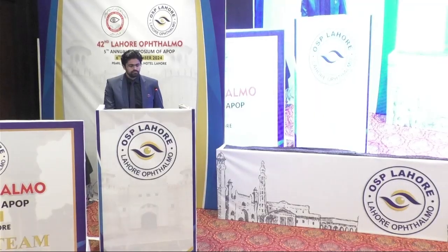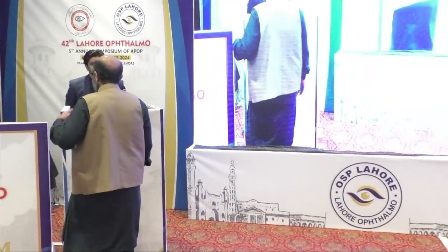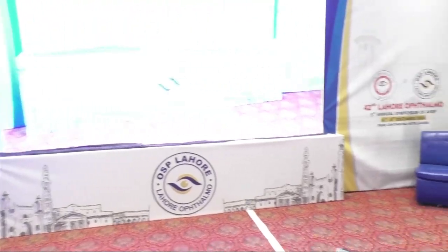One more important point: the Pentacam is not used only for diagnosing ectasias. The emphasis of this topic today was on ectasias. I use it a lot for deciding which sutures to remove after corneal surgery, like DALK or penetrating keratoplasty. Unlike keratometry, the Pentacam works on semi-meridians for astigmatism.